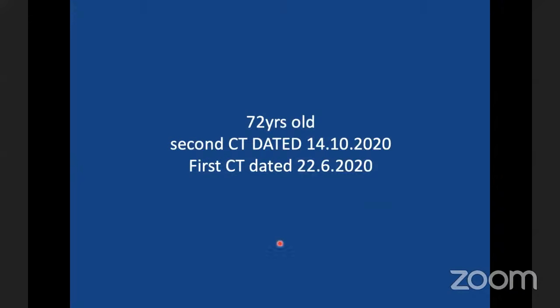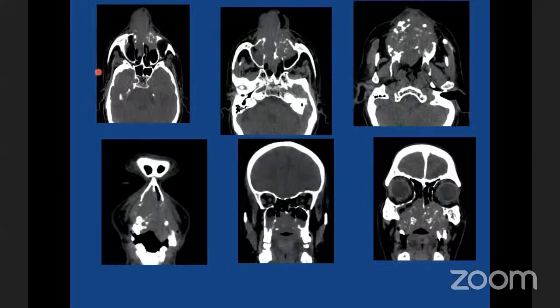Now, this is a 72-year-old patient. You will see this plain CT scan shows a large component in the nasal cavity from the anterior naris to the posterior naris with erosion of the hard palate and extension of the lesion. On the plain CT, we don't know whether this is extension of the lesion or sinusitis, because you can see the density of this is different from the medial and anteromedial component of the maxillary sinus. This is sinusitis, and this probably is the invasion of the mass.